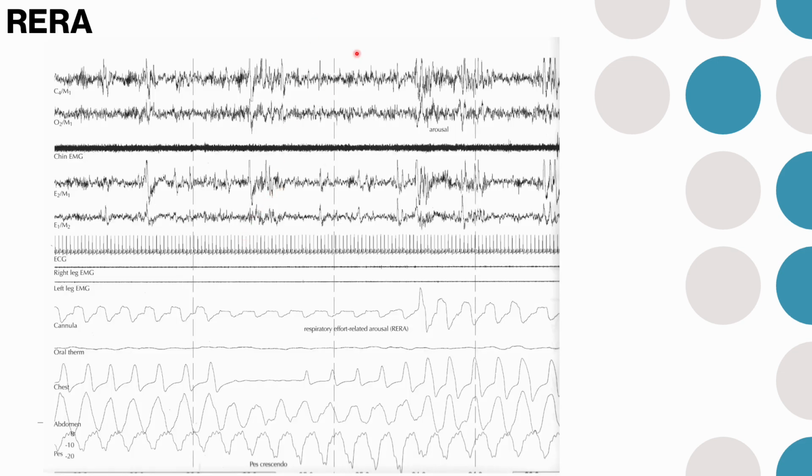So here, this is a good example of the chest belt gradually gaining amplitude while the nasal flow has flow limitation and quite a big signal loss. That's definitely, I'd call more than 30%. There's flow limitation there. Something happens right here. And look, they're paradoxing too. But they were paradoxing before, so I wouldn't include that. And they're paradoxing after, so either the belts are wrong or that's a natural thing that they do.